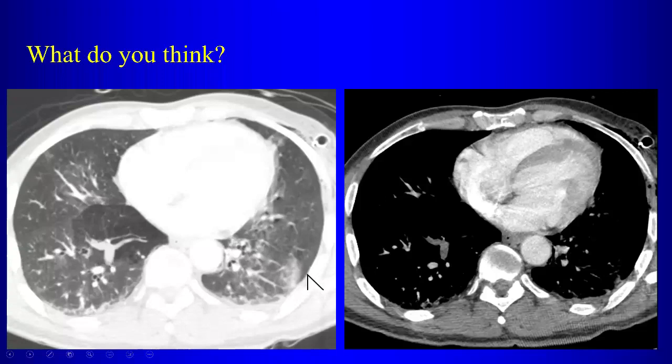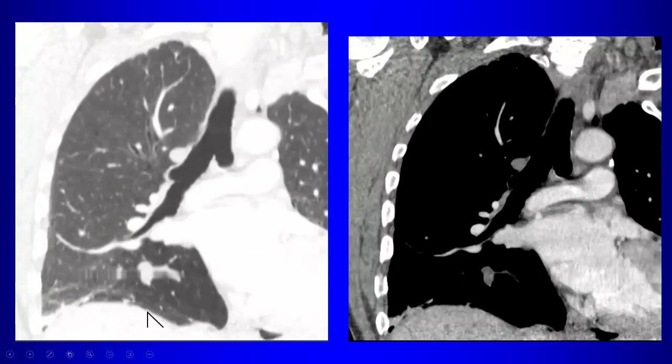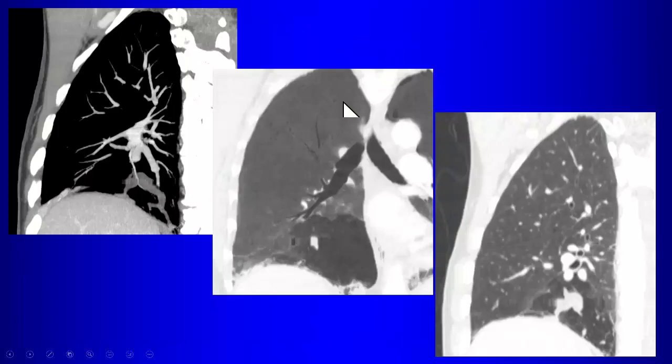Congenital bronchial atresia. So what happens is there's an atretic bronchus here, distal to it, you get the mucoid impaction, and then because of the lack of communication, you get air trapping here in the lung that is supplied by this region. So that constellation of findings, this area of mucoid impaction with pronounced surrounding air trapping, we think congenital bronchial atresia. And here you can see the mucoid impaction, the surrounding air trapping, very nicely demonstrated on that image. So mucoid impaction, branching opacity, surrounding air trapping.